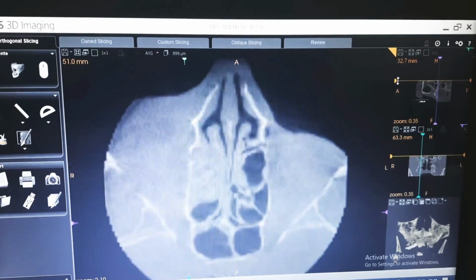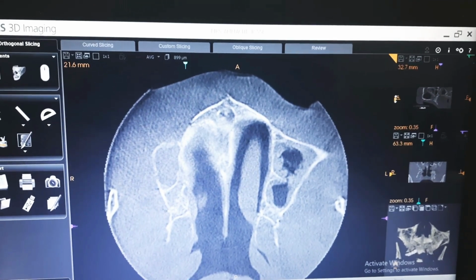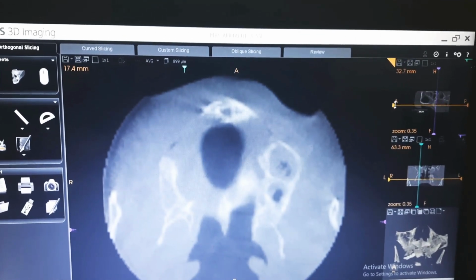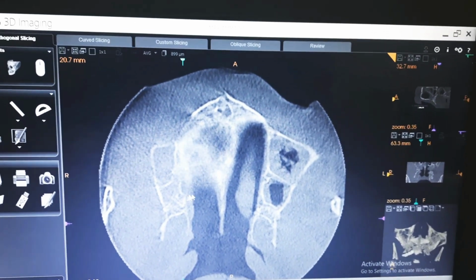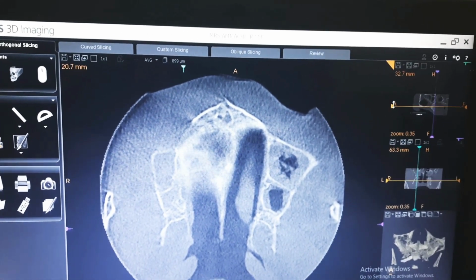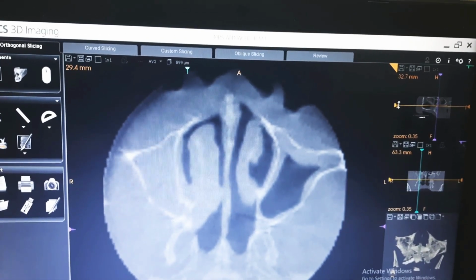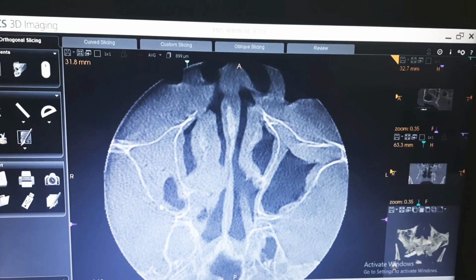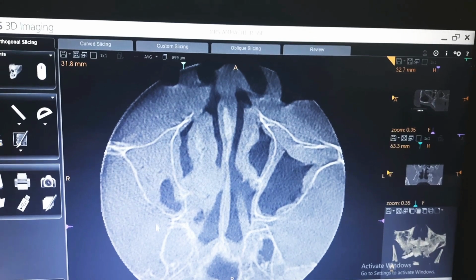It is an extensive lesion, and there is some amount of bone destruction in the right side alveolus also, and then there is opacity of the right maxillary sinus. When you compare the left and the right side, you can see the hazy opaque lesion involving the right side maxilla. The right side nasal turbinates are hypertrophied, and there is also opacification of the right maxillary sinus with some air entrapment.